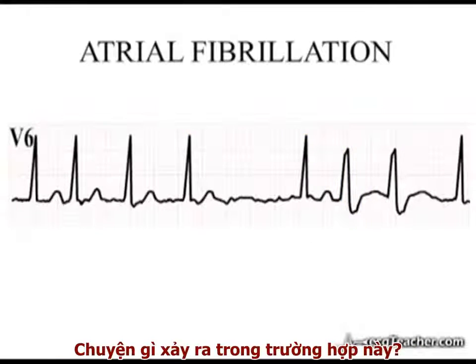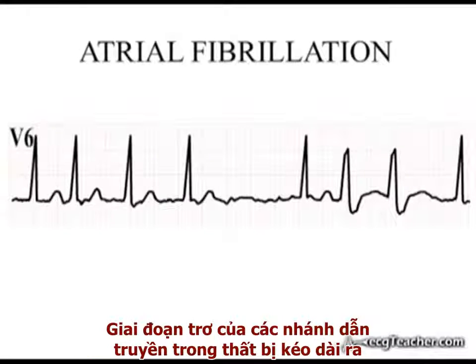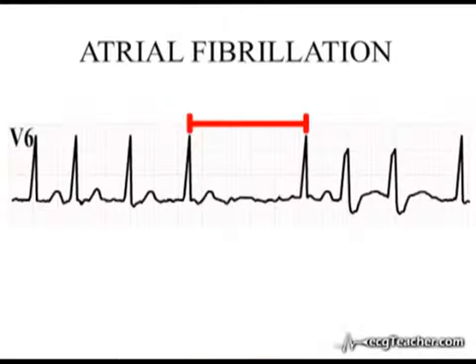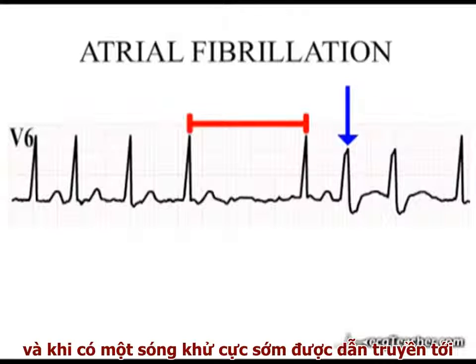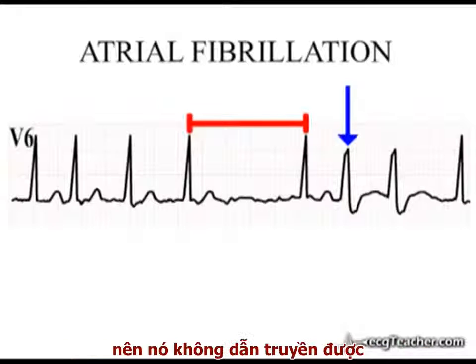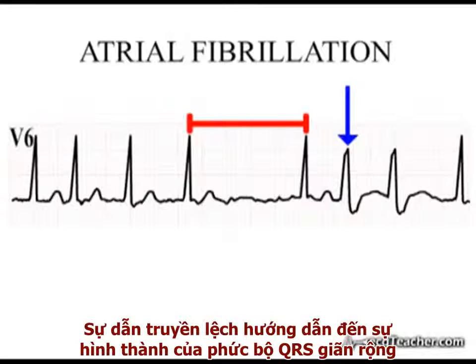What has happened in this case is that the bundle branch refractory periods have lengthened during this prolonged gap between ventricular depolarizations. An early transmitted atrial depolarization wave has then encountered the right bundle branch while it is in a state refractory to transmission. Aberrant conduction results in the presence of a broad QRS complex.